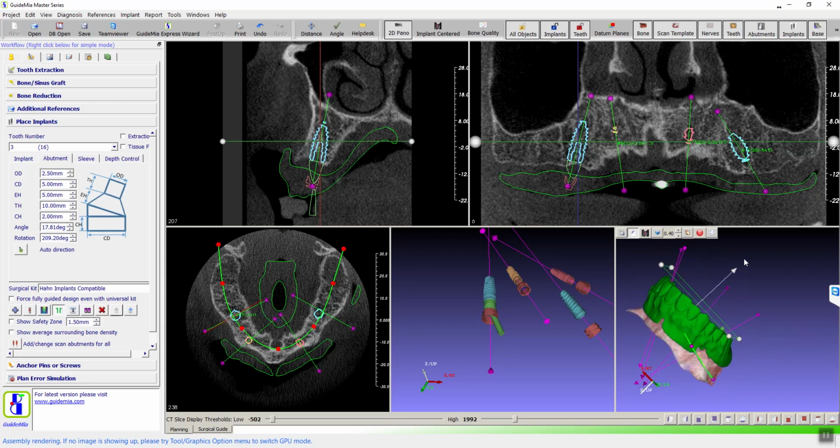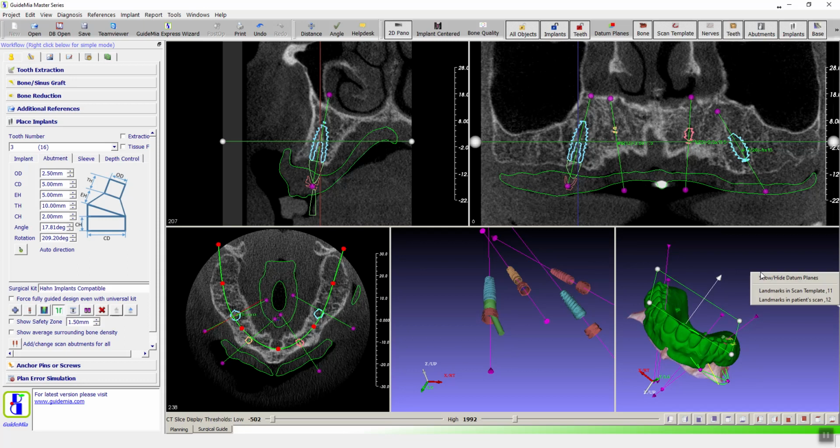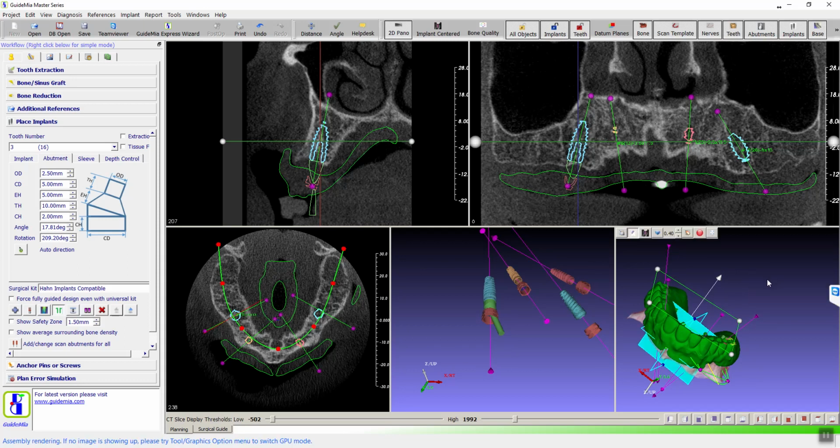Okay. But now you pick that plane. So how do you pick that? I would pick that plane based on the orientation of the teeth. It doesn't matter. What I'm trying to show you is we have this plane. We actually also have this one, which is three planes.